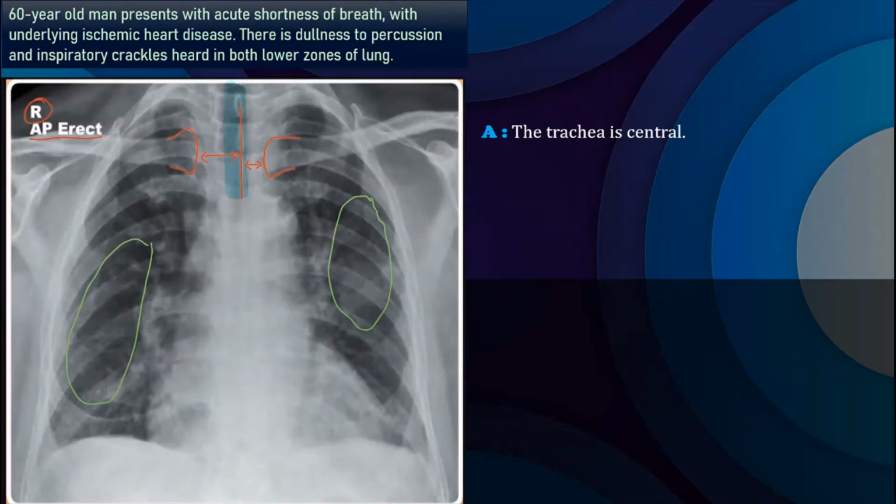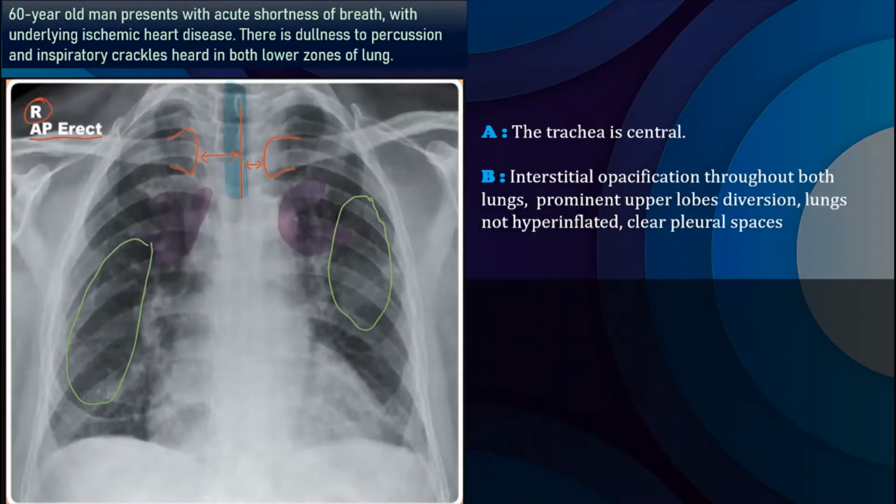The next thing that you can see that's obvious is the prominent upper lobe veins. They're pretty prominent here. So these are probably happening due to massive pressure coming out from the heart, especially from the left atrium. So that's why they are transmitted towards the upper lobe, and your upper lobe veins are being dilated so much. That's giving this kind of image in your chest X-ray.